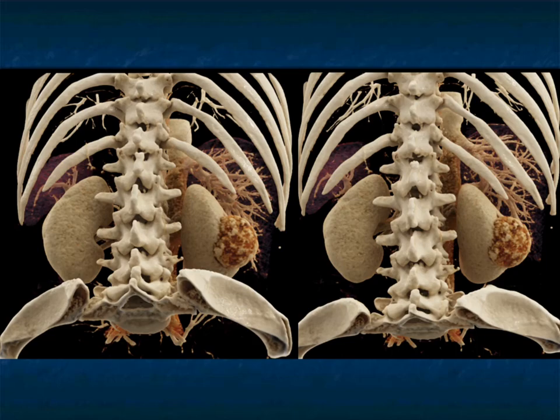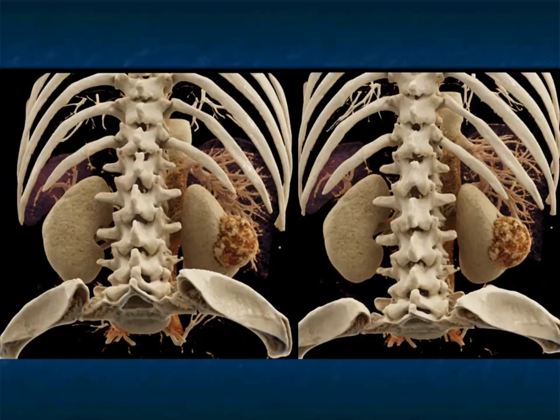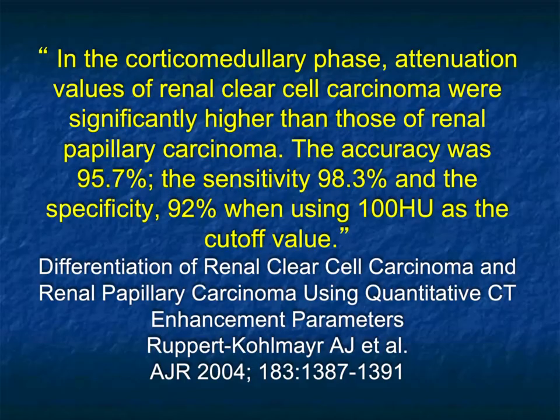Here it is from a posterior projection. There's the solid mass, the vascularity, nice surface of the right kidney, and again, taking all of those images together is what a surgeon would do in this patient when they plan on doing a partial laparoscopic nephrectomy.